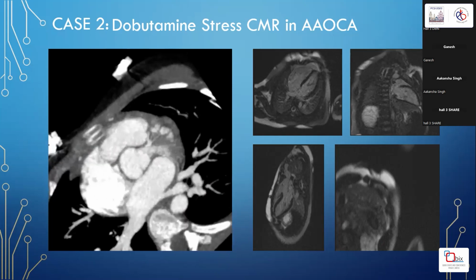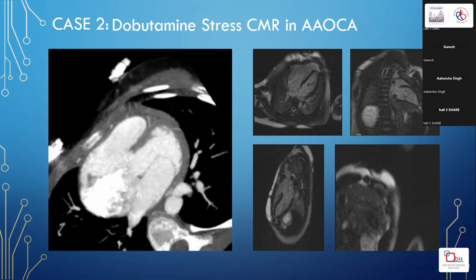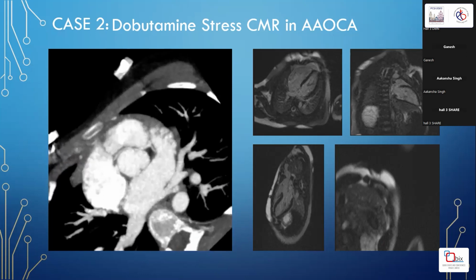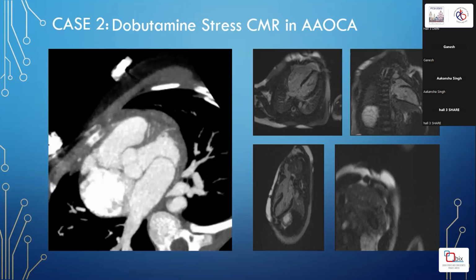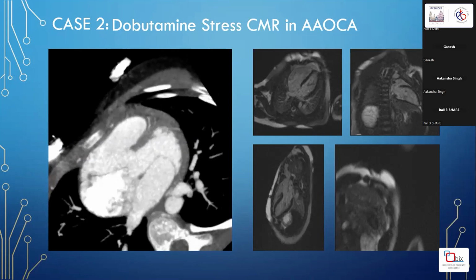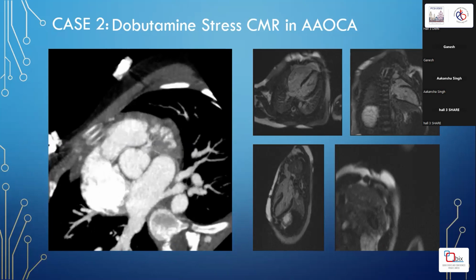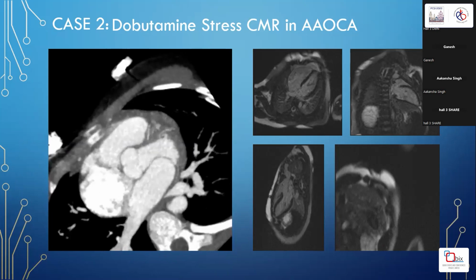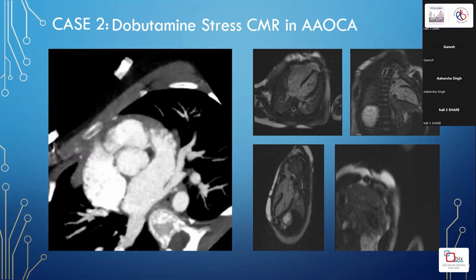The initial CT that was done just for evaluation of the coronary anatomy showed us that there was a single coronary arising from the anterior commissure, which bifurcated soon after its origin into the uniformly narrow RCA, and the left coronary had in fact a narrow segment just after its origin between the STJ and the proximal LPA, which was suspicious of an intramural course.